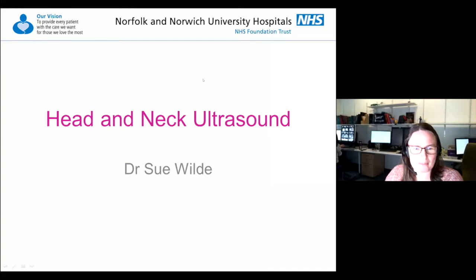Right, so I'm going to talk about head and neck ultrasound. As Davina said, I have a bit of an interest in scanning necks. I've got a few images to go through. I'll take any questions at the end, if that's okay.